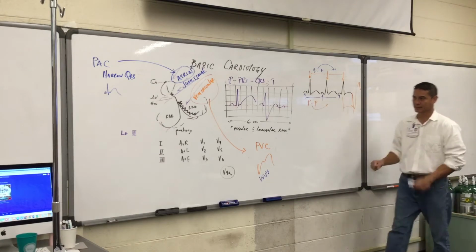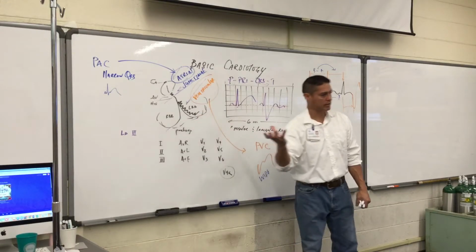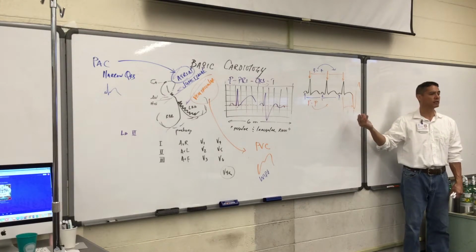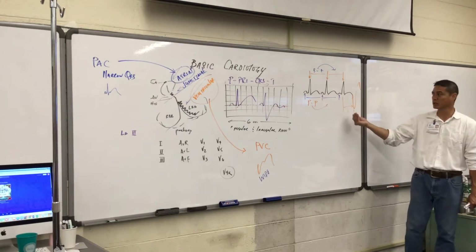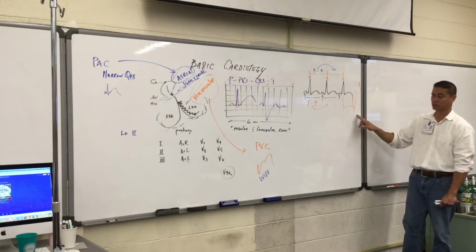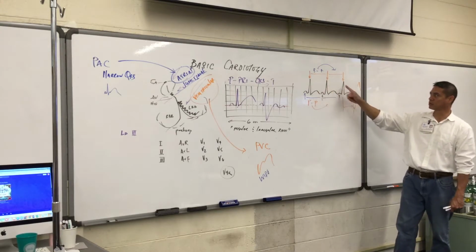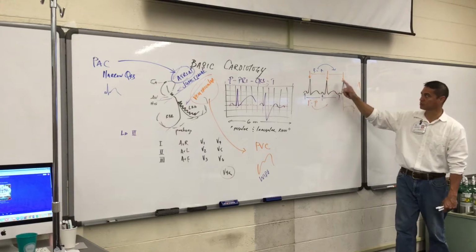When it's wide like this, it doesn't allow the ventricles a lot of time to fill up. And so with that electrical impulse, even though it may cause a contraction, it may not have enough blood volume within it to cause the pulse to be felt. So stroke volume within there is too little for you to feel actually a strong carotid pulse. So it may or may not have a pulse. Depending on how many of these are occurring, you may feel a pulse, pulse, pulse, no pulse. And then it may continue and you'll feel pulse, pulse, pulse, no pulse.